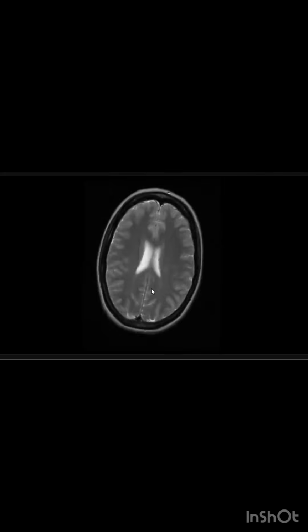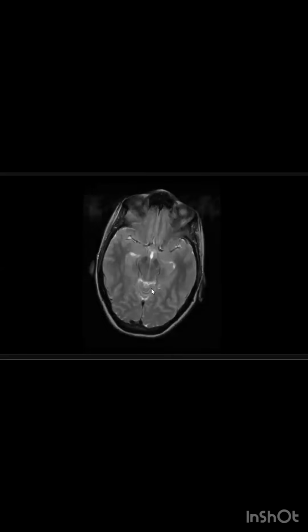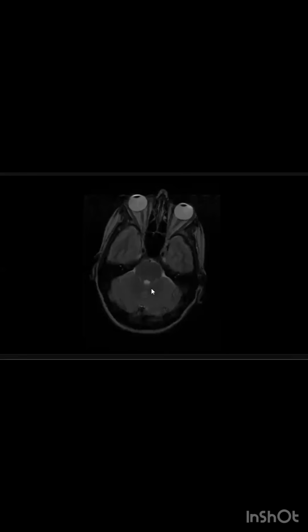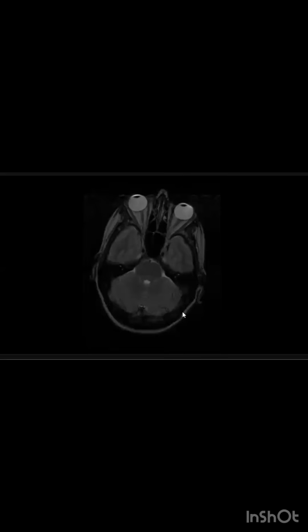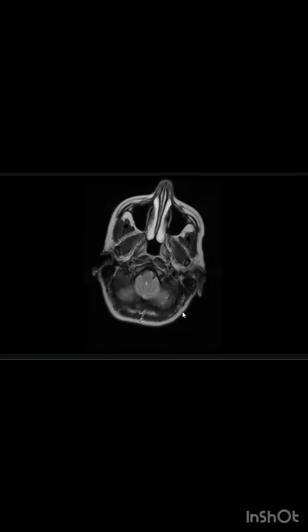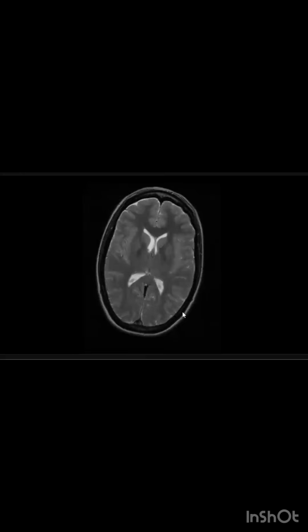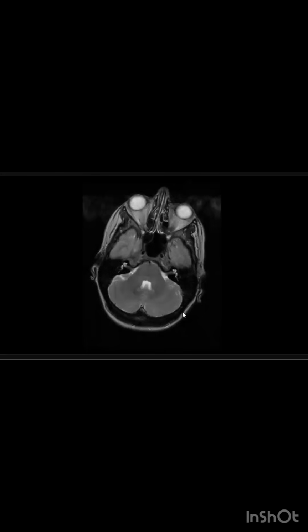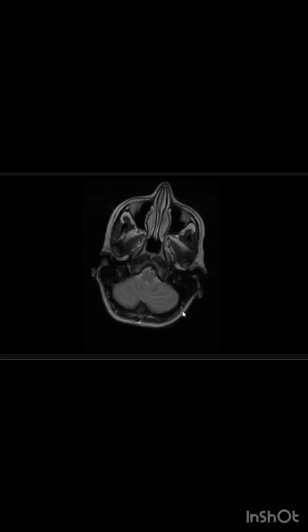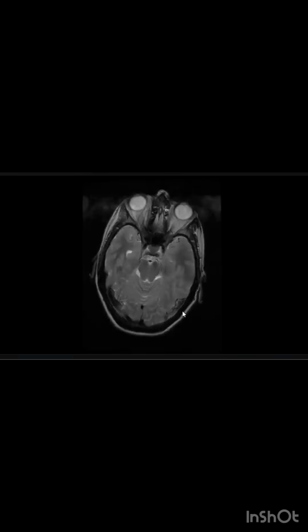I'm looking at the venous sinuses. The sagittal sinus looks normal. What is the normal appearance of the venous sinus? Usually on T2 weighted, they show low intensity. So I can see this on the right side, but the left side is not clearly seen. The left transverse sinus and sigmoid sinus are not clearly seen, no flow voids. But the sagittal sinus and the right side look normal.